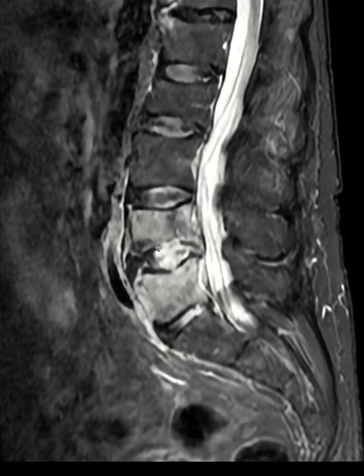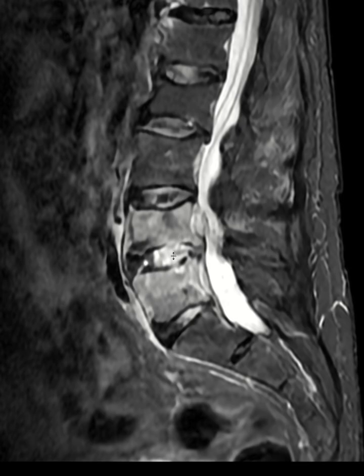which is basically edema. When we have infection, we have edema in the marrow. As you see, the L4 and L5 vertebral bodies are completely bright because of edema and inflammation. It also extends into the disc space, which is also bright. All the findings I showed you on T1 are now also bright on T2. You see prevertebral soft tissue swelling and edema. These areas are a normal appearance, nothing is going on, but here there is prevertebral soft tissue edema and enhancement, and you're going to see it on a post-contrast sequence.